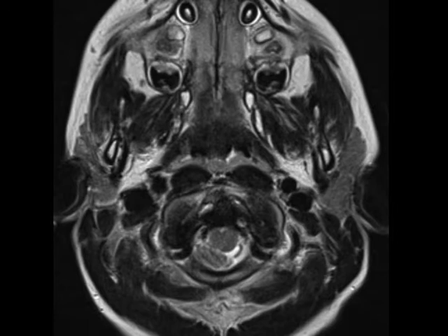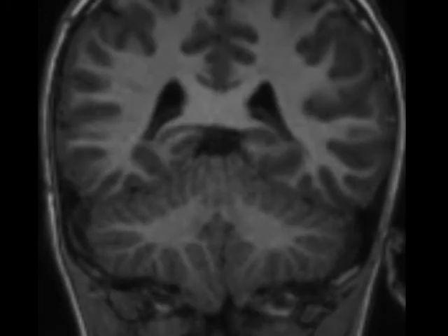Phase contrast imaging was additionally performed, although not depicted here, that dynamically showed a suggestion of mild CSF flow restriction in the posterior aspect of the foramen magnum. No syrinx formation or other cord signal abnormality was present in this case.